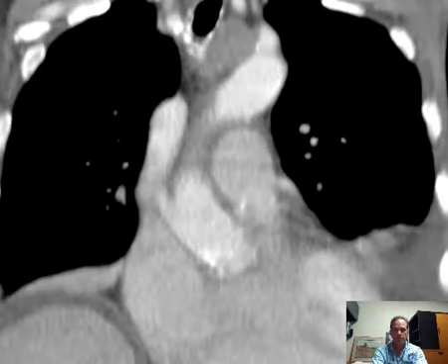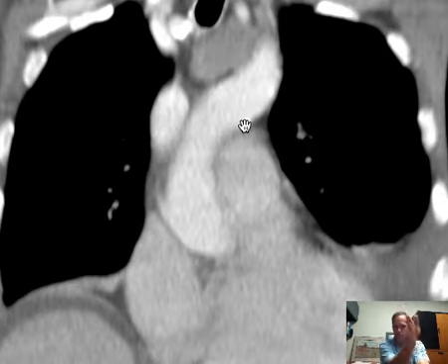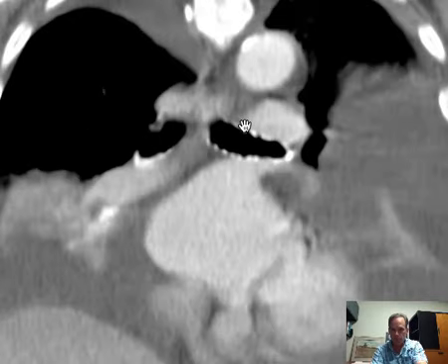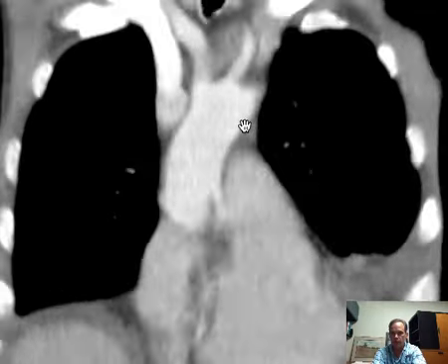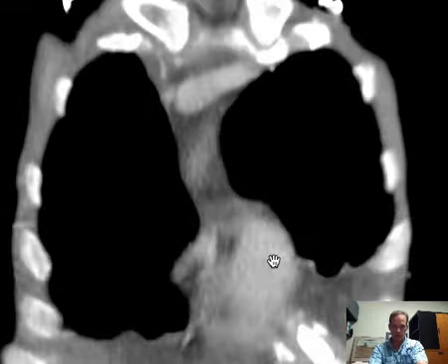All right, here we go. Now this will show you nicely how that embryology is obtained from one vessel here that is divided by a septation, and that septation divides in this manner, kind of like one of those circular stairs, and that's why the aorta, which starts out posterior to the main pulmonary artery, ends up superior and somewhat anterior to it, because the main pulmonary artery, here we are, we've gone anterior.